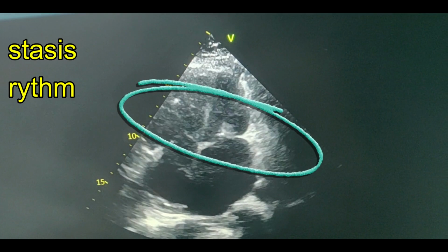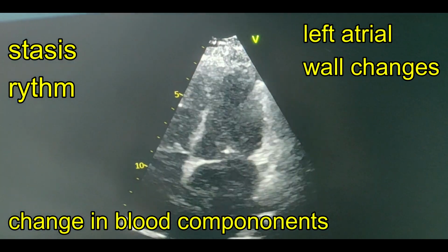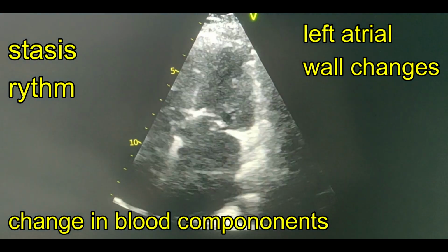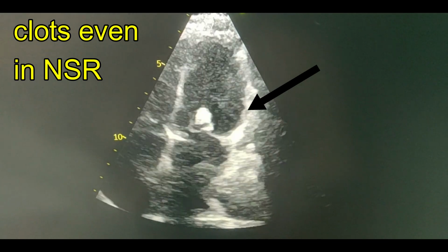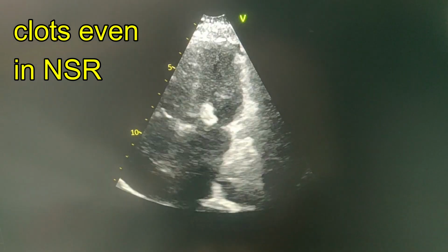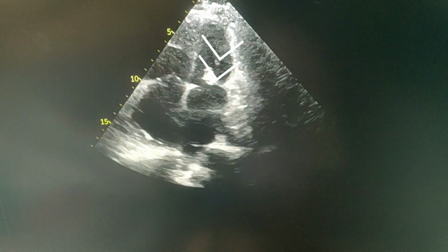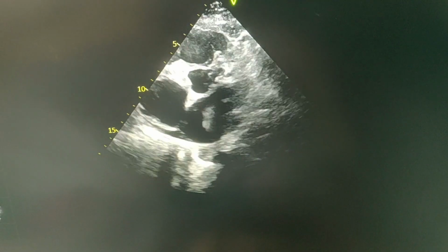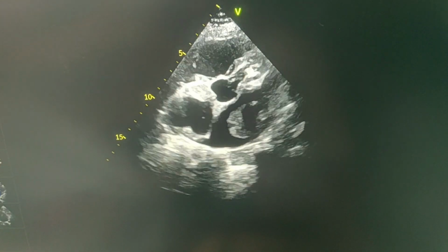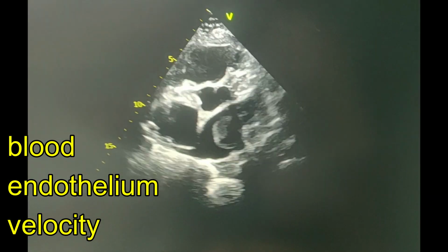Because it was a mitral stenosis, severe mitral stenosis, we know there is stasis of blood within the left atrium, and in association with atrial fibrillation, there is always a predisposition for clot formation in the left atrium. Having said that, the other prerequisite for clot formation within the left atrium is that there should be change in the cellular component of the blood, and also there should be change in the endothelium of the left atrium, the evidence for which is not clear.